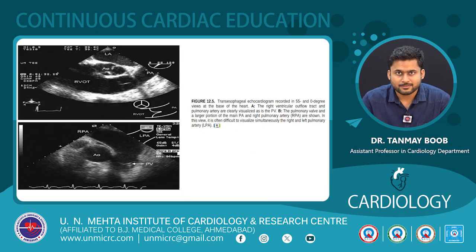The first image, A, is a transesophageal image recorded at an omniplane of 55 degrees. It demonstrates the RVOT, the pulmonary artery and the pulmonary valve, which can be clearly visualized. The B image shows the pulmonary valve and a larger portion of the main pulmonary artery with the RPA at an omni angle of 0 degrees.